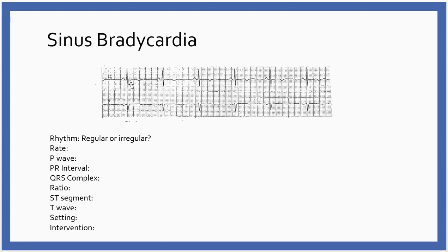ST segment. So remember, the ST segment is this stretch of time from the end of the QRS to the beginning of the T wave. Now I got a funky little T wave here. I can't even see it on the V lead, which is not good. Not that it's not good patient-wise, it's not good in terms of documentation. Somebody should have gone back on here and made sure that the leads were placed appropriately so we could actually see everything that we needed to see.